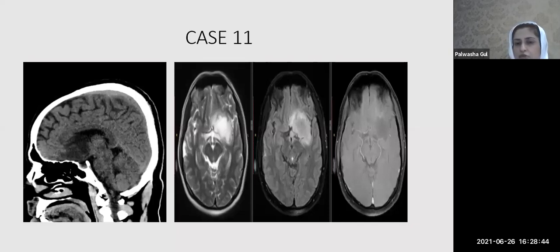So previously this sign was used for protoplasmic astrocytoma, but that has been removed from the newer WHO glioma classification. And now this is used for astrocytoma, which is IDH mutant, which is grade 2. So you can always tell in your MDT that it's T2 FLAIR mismatch. I feel we are dealing with an astrocytoma, grade 2 IDH mutant, okay?